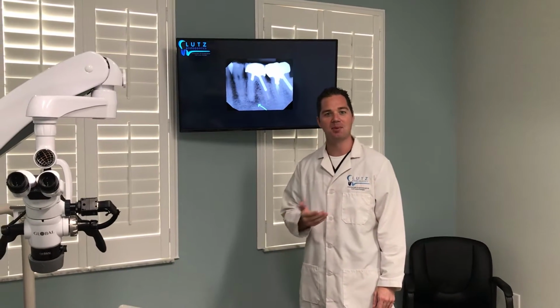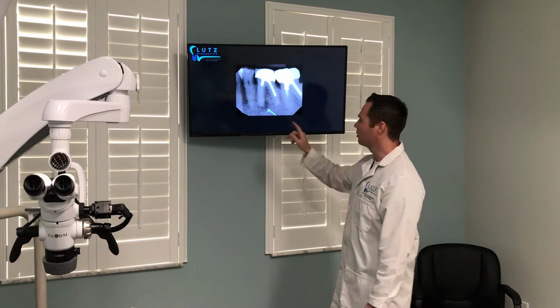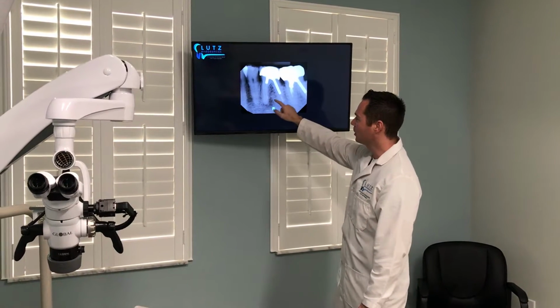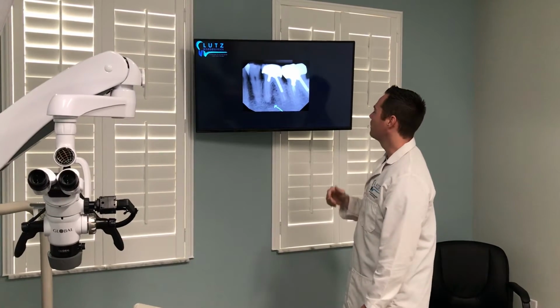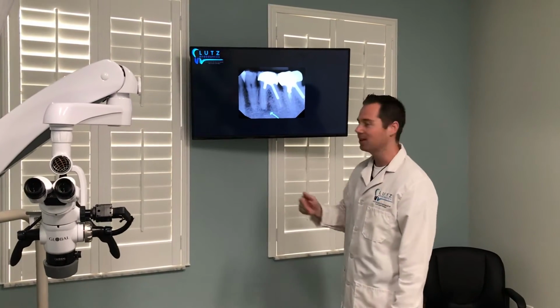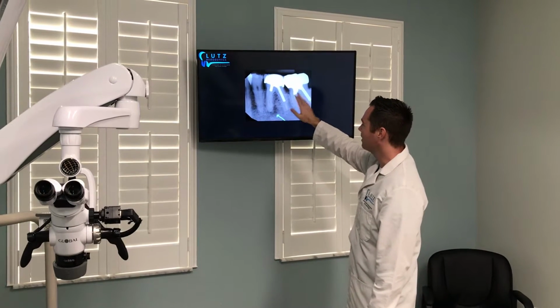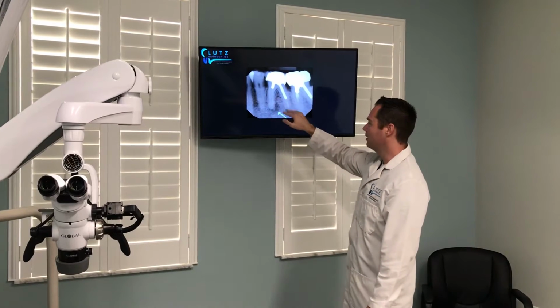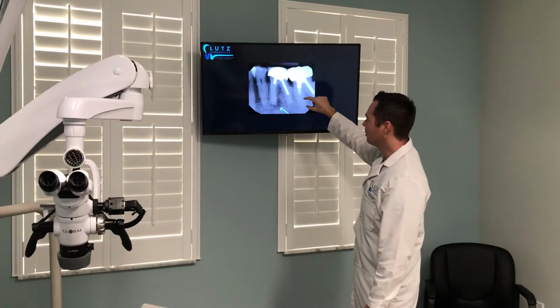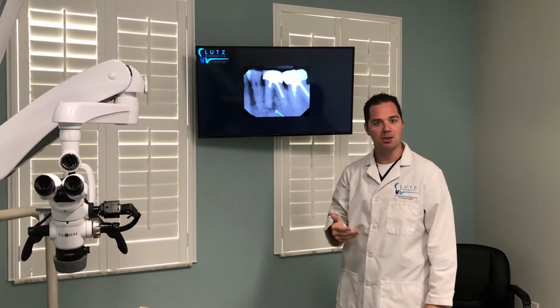62-year-old male who presented with swelling on the lower left-hand side associated with tooth number 19. You can see this mesial buccal root has a periapical radiolucency associated with it. Both these root canals were over 10 years old. He has a large post on the distal of both 18 and 19. Root canal treated on both of the teeth, and what you can see is an inadequate obturation on both. We found that only 19 was contributory to the swelling.